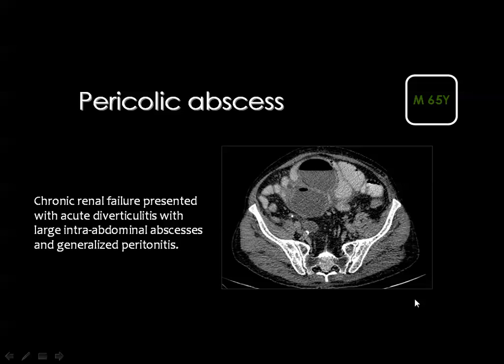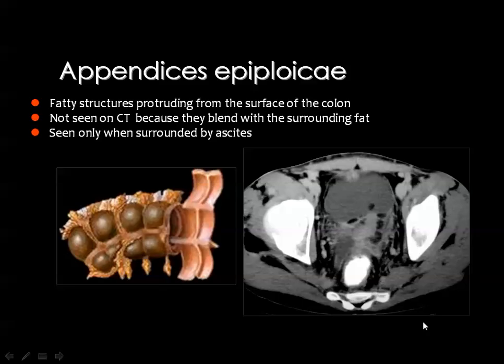Then usually colonic diverticulitis, whenever it perforates, will not lead to generalized peritonitis, because the perforation is usually very slow and localized, limited to the pericolic inflammatory changes. Then commonly you see as a complication of diverticulitis a pericolic abscess rather than generalized peritonitis, and this is a bilocular abscess cavity with air-fluid level inside, thickening and enhancement of the wall.